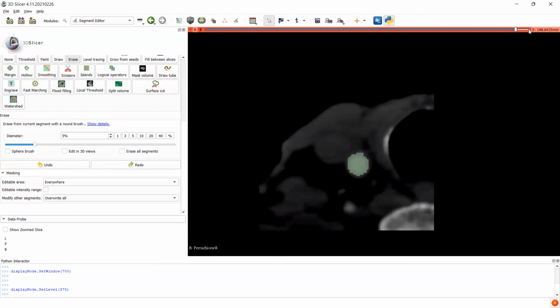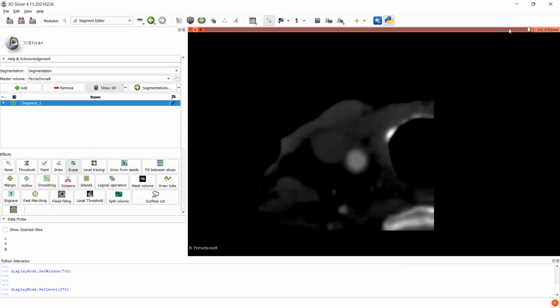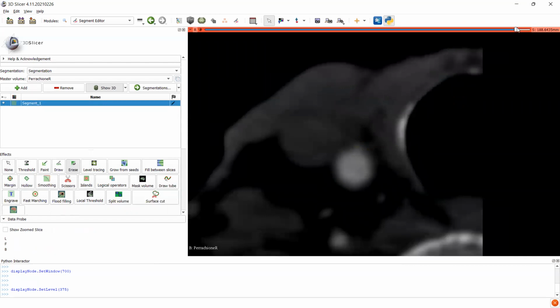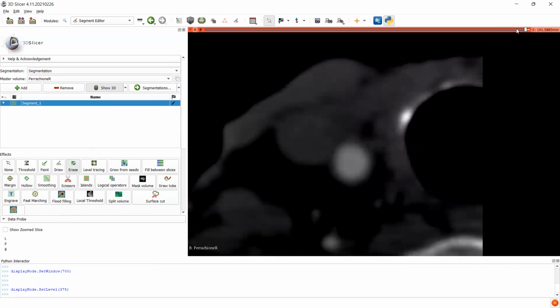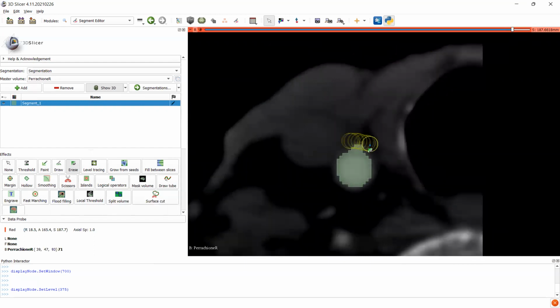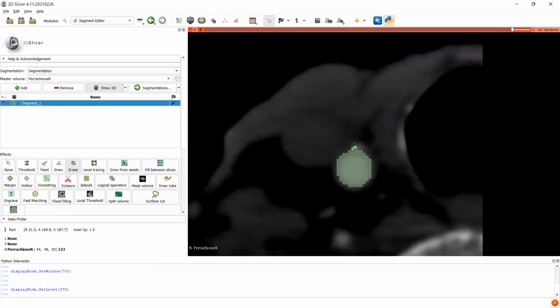And you see, you're just going to scroll through this right next to the segment area. Click this button to toggle the segmentation on and off. So, for example, this part. This is all pretty clean. You don't really need to mess with Slicer's algorithm. This isn't the region of interest either. You could probably remove this part. It's pretty insignificant compared to the rest of the plaque, but I'm going to remove it for the sake of demonstration. That's probably not part of the flow lumen.